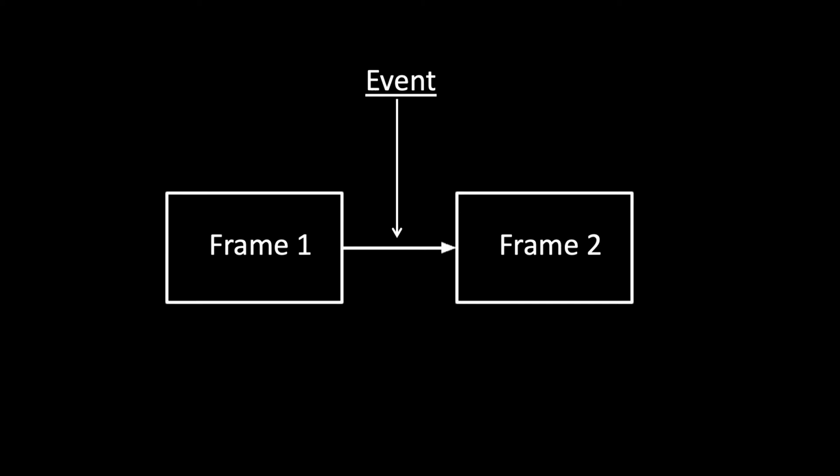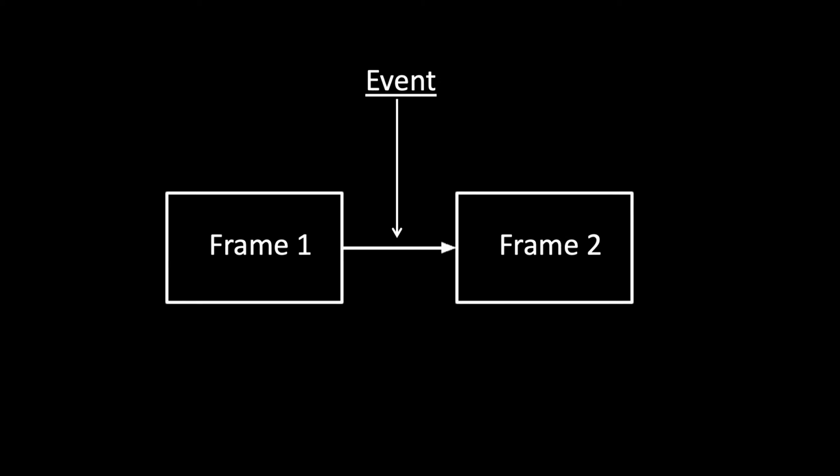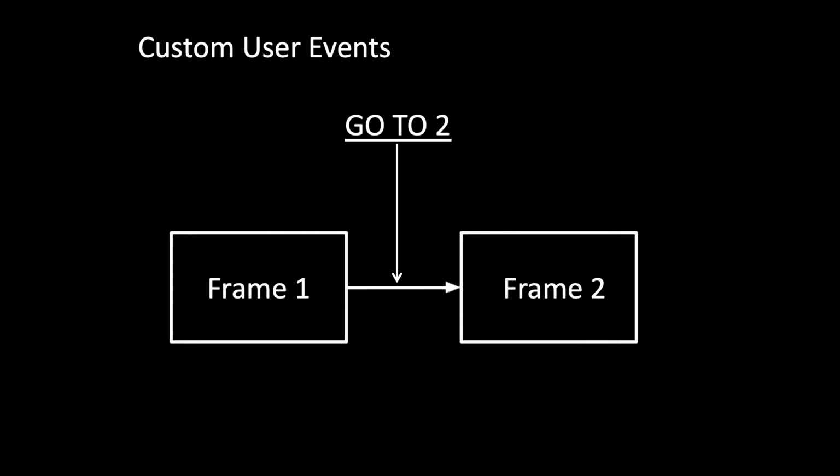LEAP Scenario Design is a series of frames that each contain mannequin settings. As the learner completes pre-programmed events, the scenario progresses to the next frame. These events can be manufactured, predefined user events, time-lapsed based, or custom user events. Our process of creating scenarios in SimDesigner eliminates manufactured predefined user events. We will continue to use the time-lapse based events and create custom user events.